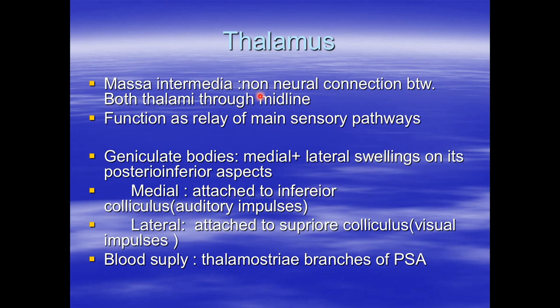Especially the posterior limb of the internal capsule is very densely packed with motor fibers, while the sensory pathways are relayed in the thalami bilaterally.